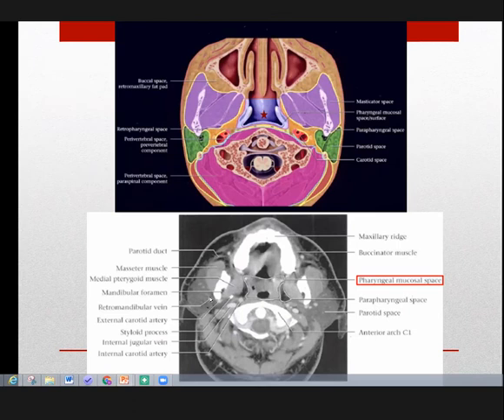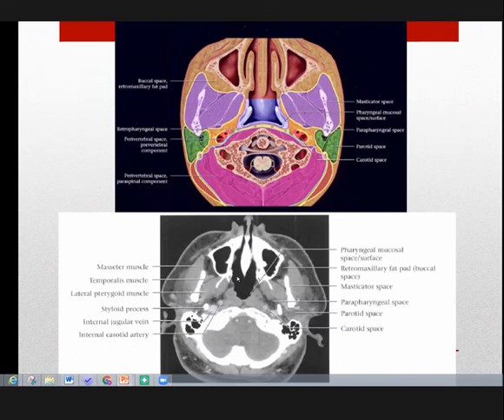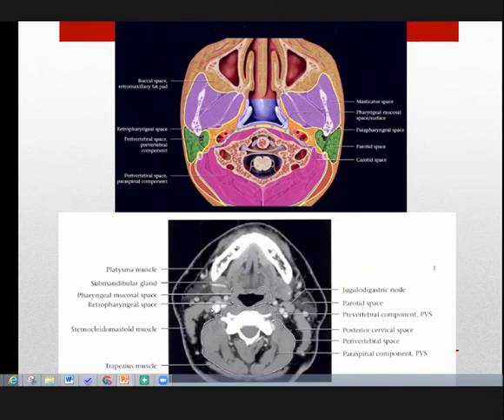So this image where the star is located is your pharyngeal mucosal space. Okay. As you can see here, this part is made up of the middle layer of the deep cervical fascia, while the airway side has no fascial margin. So, in viewing the CT scan, cross-sectional imaging, this area is your pharyngeal mucosal space. This part, the level of the nasopharynx. Okay. And this part also. Okay.